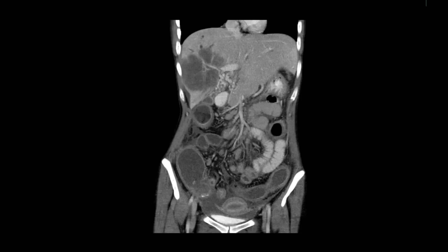So colitis, could be infectious, inflammatory. So this is infectious. Why infectious? Sir, because in infectious colitis, we have enlarged lymph nodes. What about tumor? Or what about ulcerative colitis? Yeah, in ulcerative colitis also he can have lymph nodes.